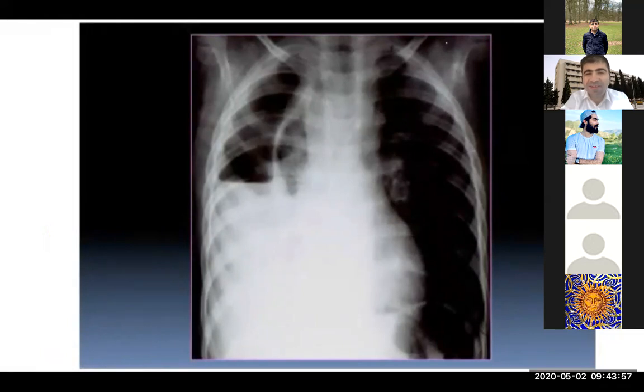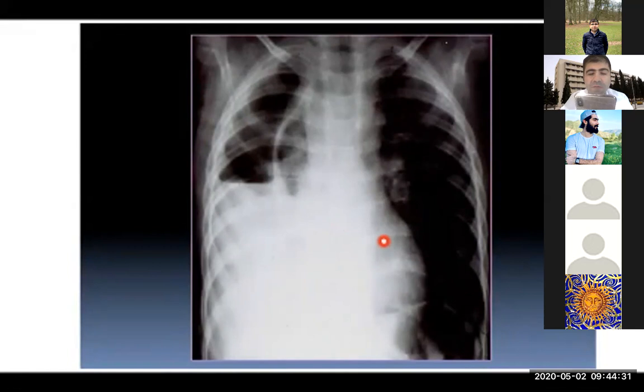The schema according to the ABCDEF system. So A for the airway. Okay. If there is a normal airway. B, there is no any lesions, bony lesions. Okay. And C for the cardiac shadow, it is sharp and it's normal position. So do you see all the margins of the cardiac shadow here?